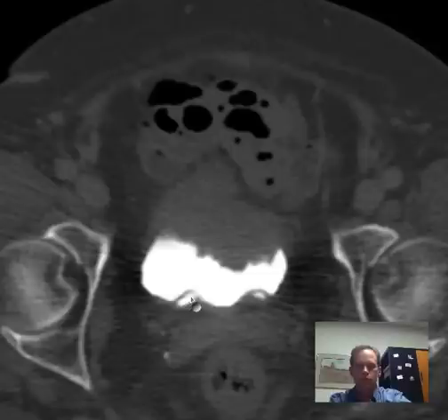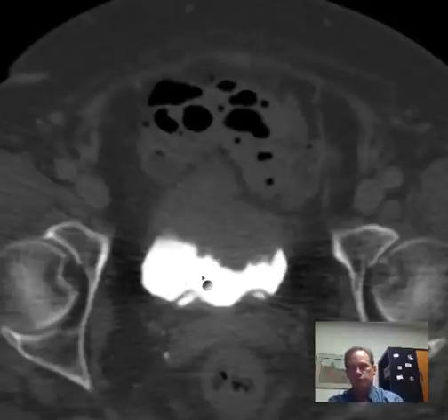I see two distal ureters, or the ureterovesical junctions, present on both sides. I see contrast getting into the urinary bladder, which is basically urine that is opacified with iodinated contrast. It's the iodine compounds in the contrast that gives it this high attenuation, so that we call it dense.